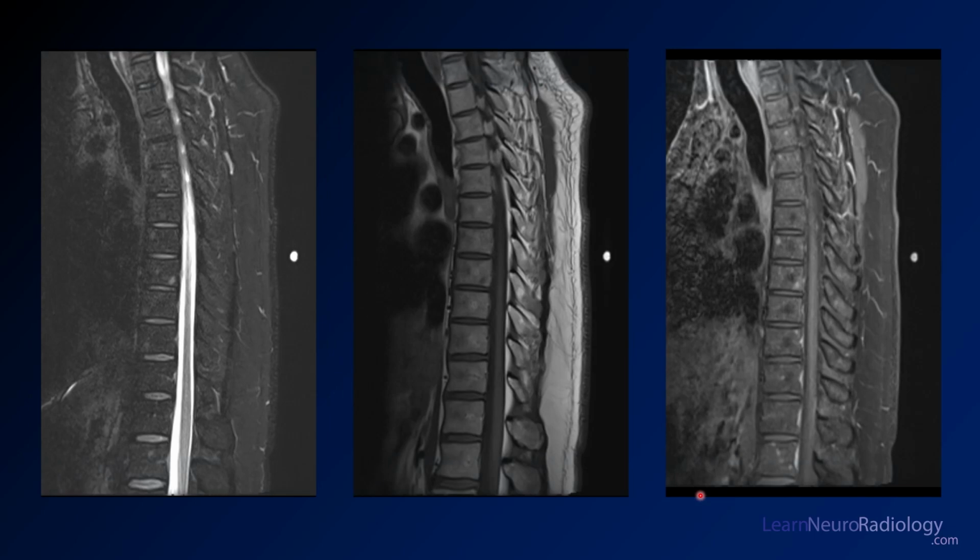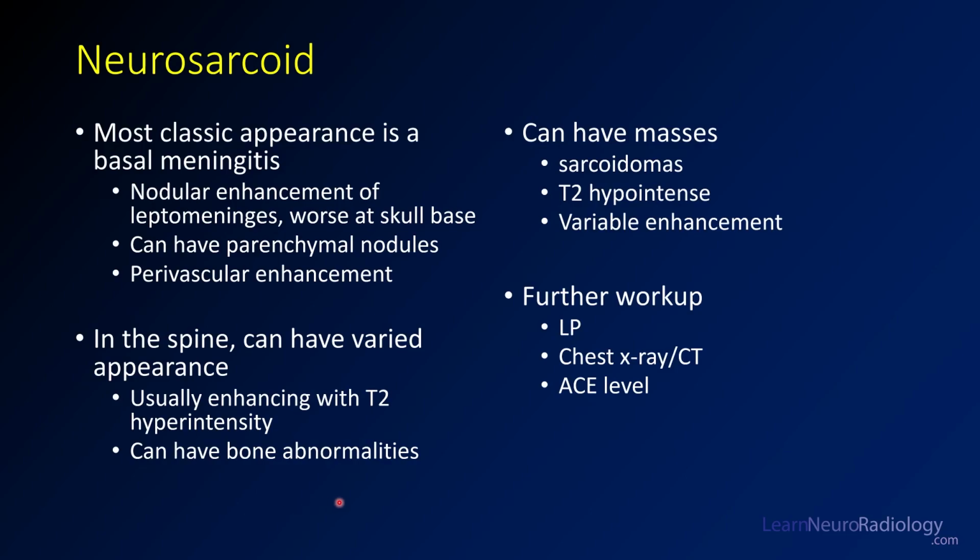Now, if you take a look at this person's thoracic spine, you're going to see some companion findings, so to speak. On the T2 fat sat, there's some patchy, irregular abnormalities of the bone marrow. On the T1, similarly, usually the bone marrow is a little bit more homogeneous. You just see these patchy areas of abnormality, which are a little bit heterogeneous. And on post-contrast imaging with fat saturation, you see similar findings. The marrow is kind of irregularly enhancing there. So something's involving the bones diffusely.